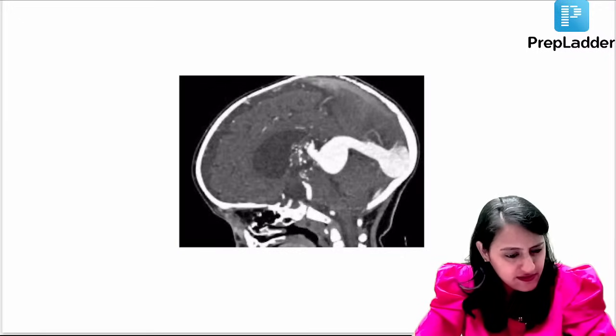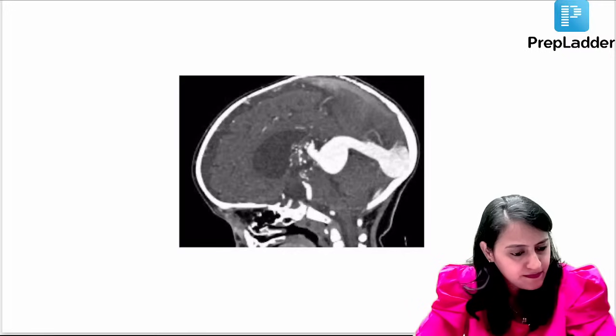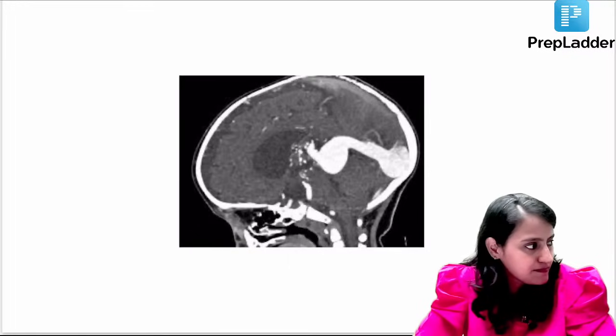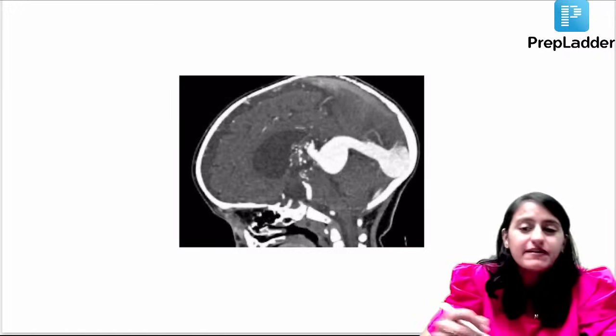See the comments, just a minute. Okay, now I can. Yes, this is the vein of Galen malformation.